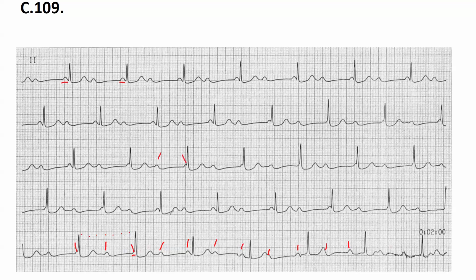What does it mean? Is it like the Mobitz type? No. Mobitz type is a second degree block, and that is not rhythmic, and this is rhythmic, and we said that there is no connection between the P and the QRS. So what can it be?